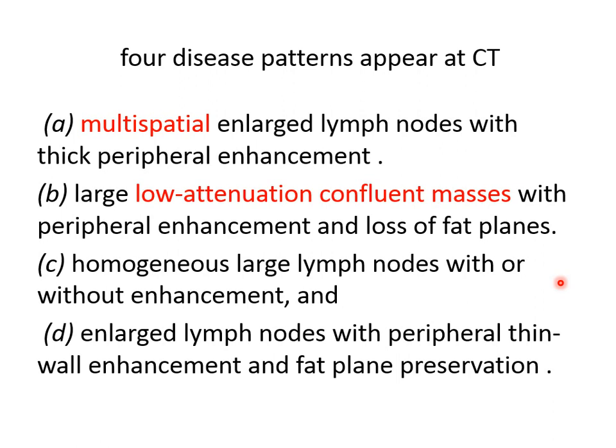But the first and the second are more specific for TB, because they change multiple necrotic, infected lymph nodes into a large necrotic mass.